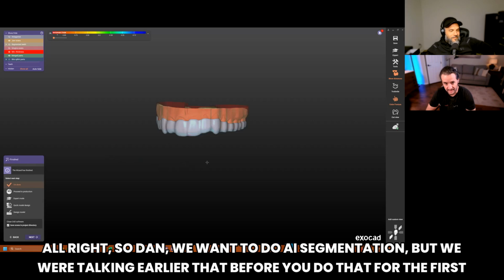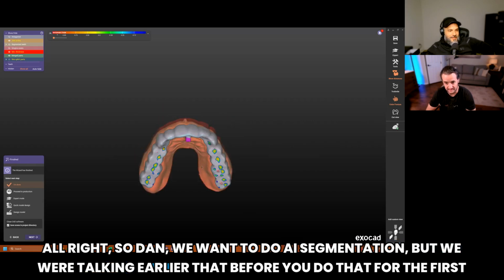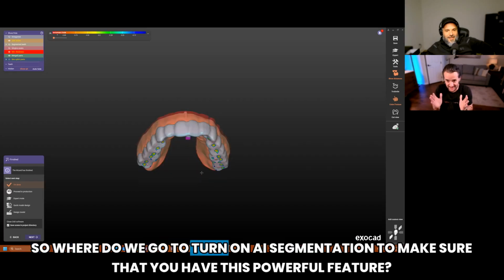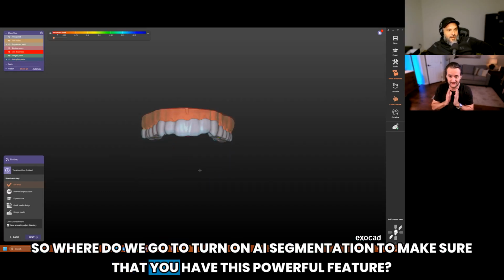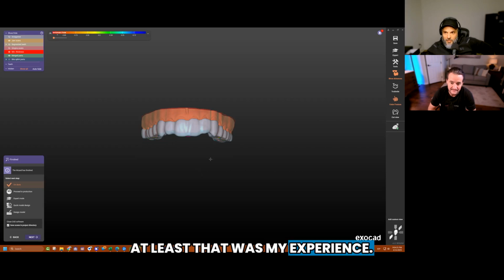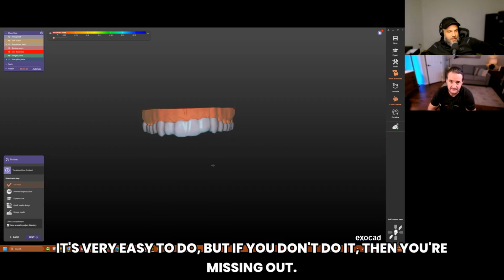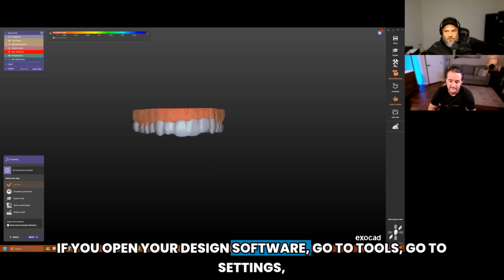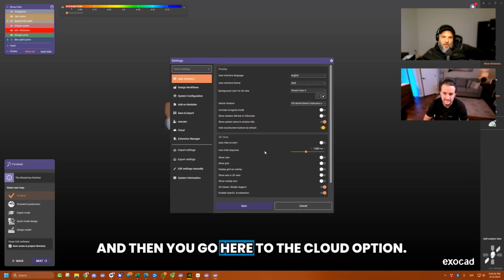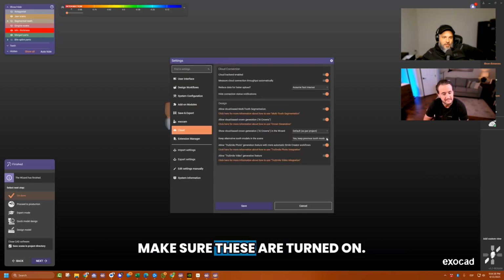All right, so Daniel, we want to do AI segmentation, but we were talking earlier that before you do that for the first time, you've got to turn it on, right? So where do we go to turn on AI segmentation to make sure that you have this powerful feature? So all of the AI tools need to be enabled manually. At least that was my experience. It's very easy to do, but if you don't do it, then you're missing out. If you open your design software, go to Tools, go to Settings, and then you go here to the Cloud option. Make sure these are turned on.